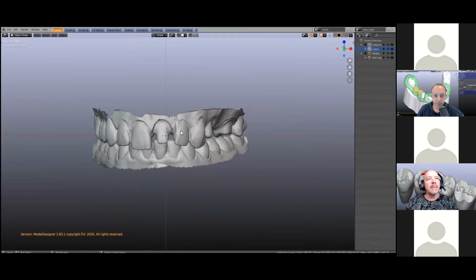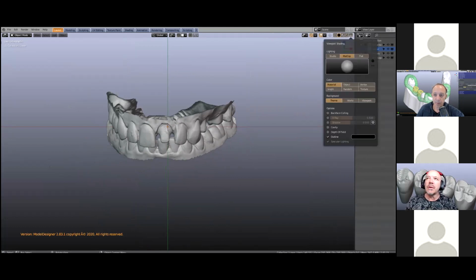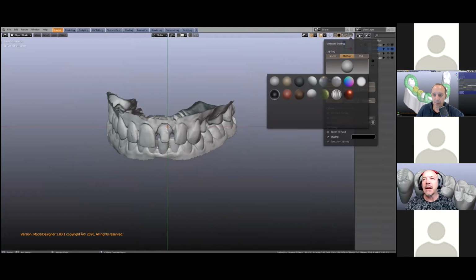And now we're working with objects in Blender, which are STL, OBJ, or PLY. We can color them. So what I'll do is up top here, there's something called matcaps, and Blender comes with certain matcaps shipped. You can make your own, by the way. We've made our own on the internet. There's tutorials on how to make your own.